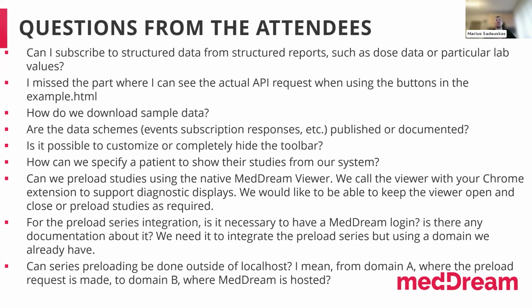It's possible to do preloading when you open the study in MedDream, but if you want to preload the hidden studies, it would be only with the communication API. If you just want to open the study and automatically start preloading, it's possible to have this enabled in the settings.